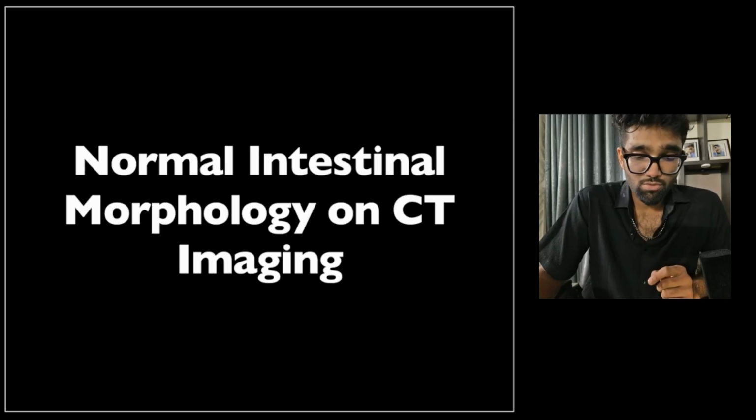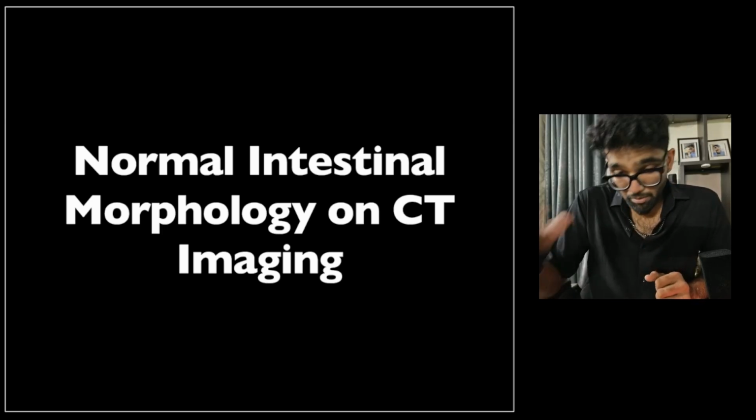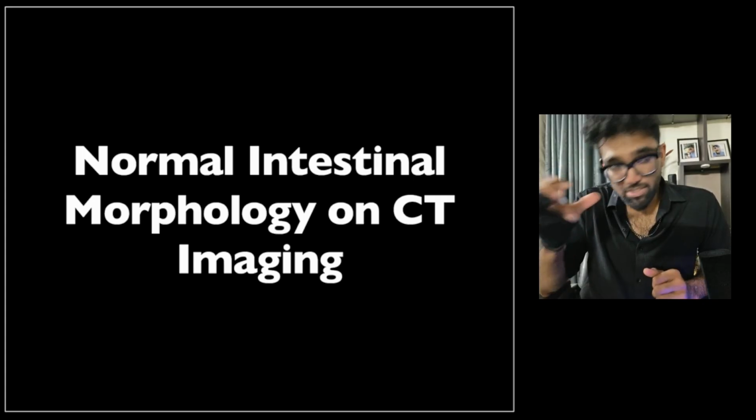the bowel wall morphology that you normally get in these two entities. So coming to the normal intestinal morphology on CT imaging.